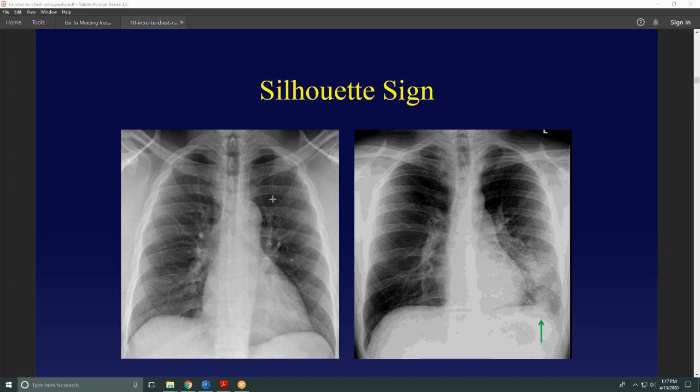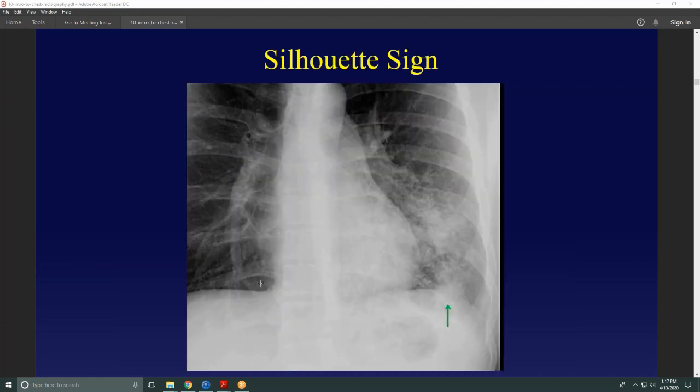If you lose your aortic border and there's opacity over here, you don't know what that opacity is, but you know that it's touching and in contact with the aortic knob. Same thing for the chest wall, and like the vessels up here in the upper thorax. So that's very helpful for localizing the position of an abnormality. And there's a zoomed in example of where better, here we didn't get as pixelated, showing where the diaphragmatic contour is lost.